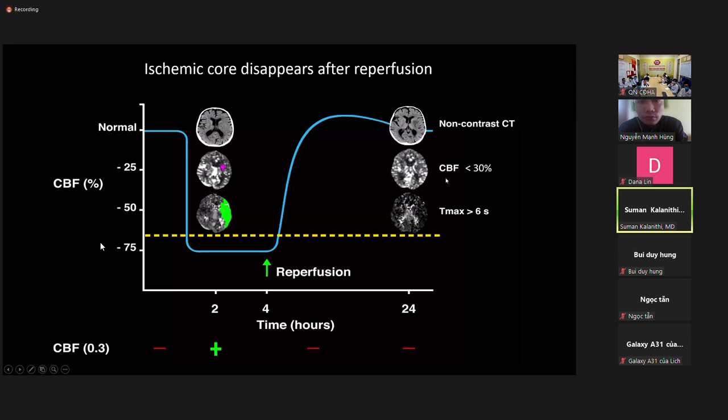The reason is very simple. It's because if you remove the clot, blood flow is now normal everywhere, including through the dead tissue. It's not true that when tissue dies, all the blood flow just stops. So that's why you may see this pattern. It seems confusing, but it's really not. And the simplest rule is that whenever you see something on non-contrast head CT, doesn't matter what perfusion says, this is it. That's dead. You're done. Finished.